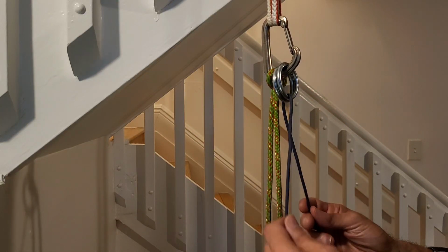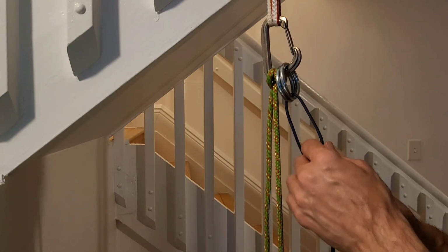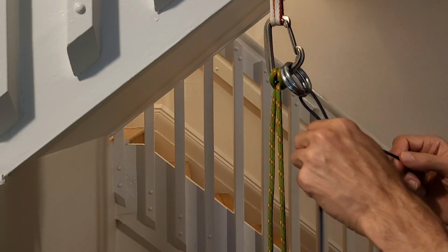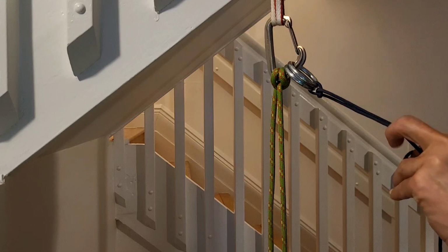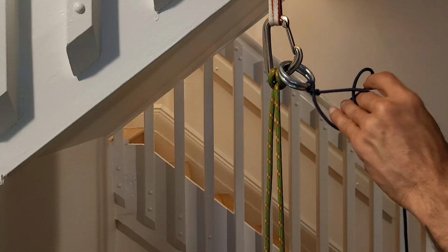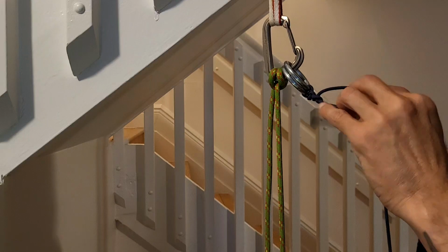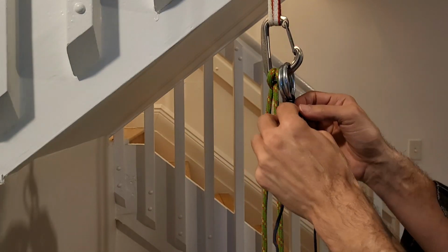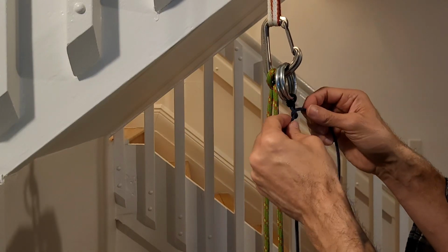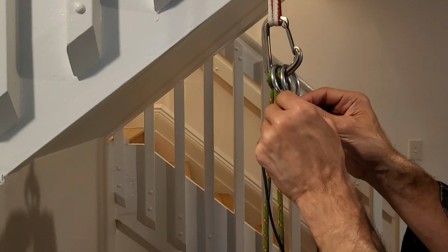I'm going to demonstrate the end goal, which is slip knot secured by square knots. So here's our slip knot. It's 1, 2, secured by a square knot. This is used in surgery such as to attach tendon to bone. The slipping or sliding nature of the knot brings things such as tissue together during surgery.